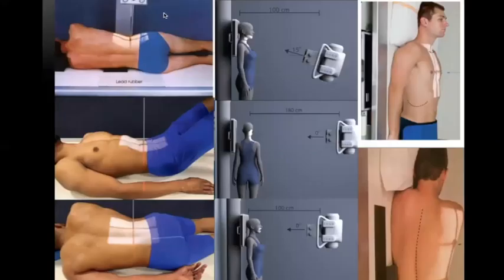All right, so these slides are actually showing you the positioning of the spine radiograph. On your most left hand side, you can see these are the lumbar spine, on lateral, AP, and also obliques. These are how they are positioned. In the middle you have the cervical, so this is AP, lateral, and these are open mouth views. On your most right hand side, these are the thoracic vertebra radiographs. So this is positioning. I have to rotate it, so kena pusing kepala sikit lah, tengok.